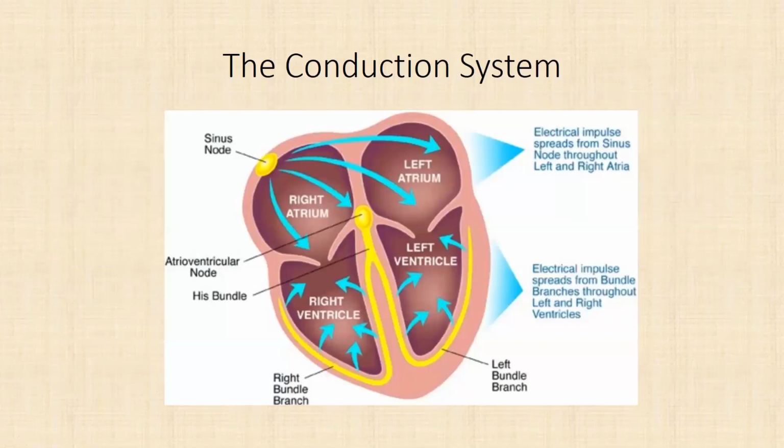All right, so like I said, one spot has gone crazy in the atria and keeps firing, and only a few actually get through the AV node. So maybe right here is the irritable spot, and it fires, fires, fires, fires, and then finally one gets through to the ventricle. Then you can see a QRS, and then we see P wave, P wave, P wave, P wave, P wave, and then one gets through the AV node and we get a QRS that fires off. So really there's just one spot in the atria that's irritated and keeps firing.